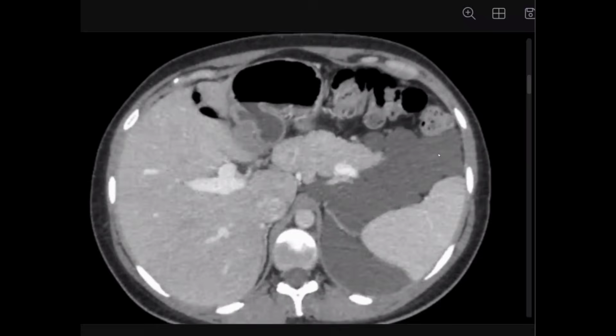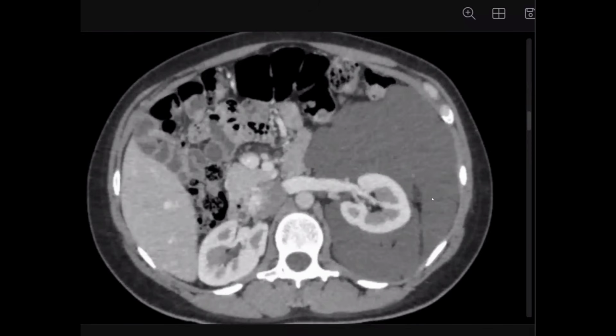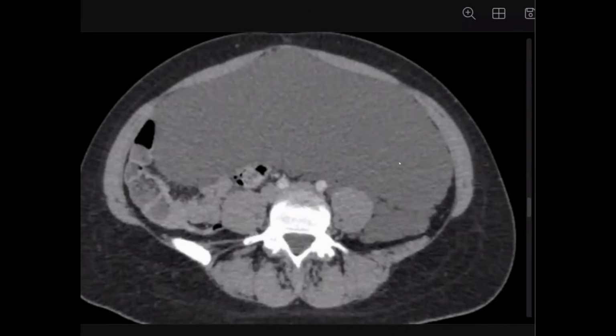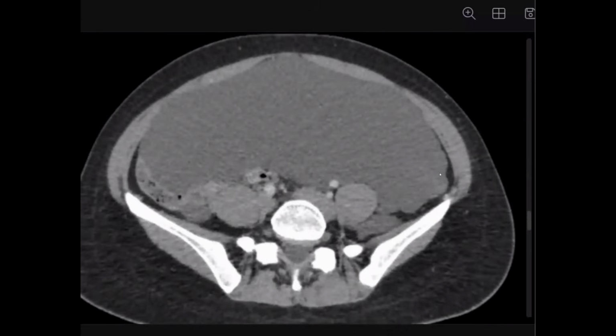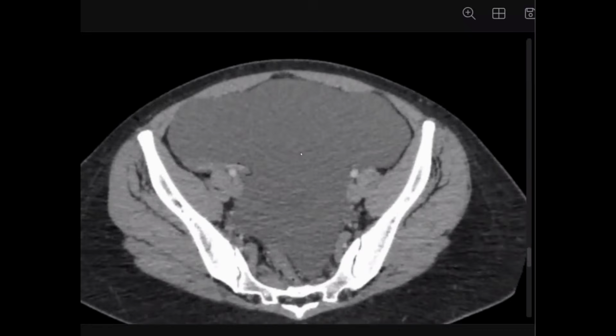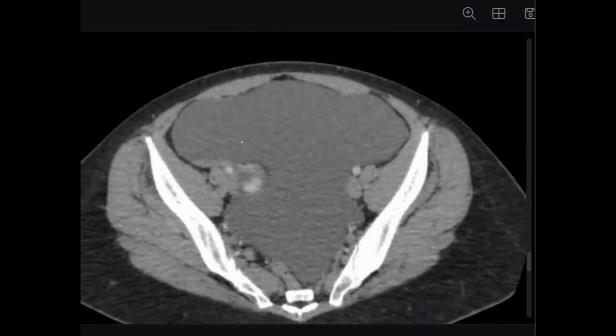How can we confirm that this is retroperitoneal? Because it is displacing the descending colon anteriorly, and the mass is present surrounding the renal fascia. Yes, perirenal space, pararenal space. What is this space? This is the inferior space which extends from the pararenal fascia down towards the pelvis. I think this one is peritoneal space.